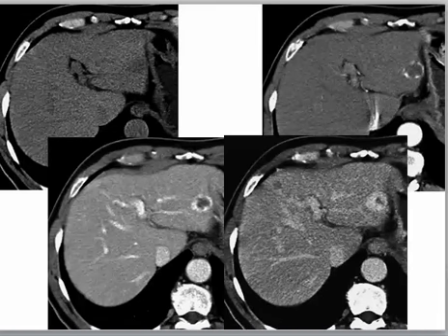This is a typical example of the hemangioma, starting here as a low density area. Then in the arterial phase dynamic, we start to get the nodular enhancement, which becomes more and more, and then the closing iris sign, where the hemangioma is closed almost completely. This is typical for a hemangioma.